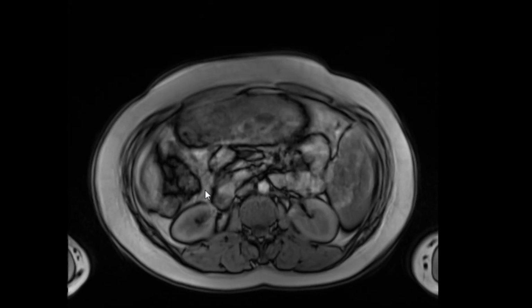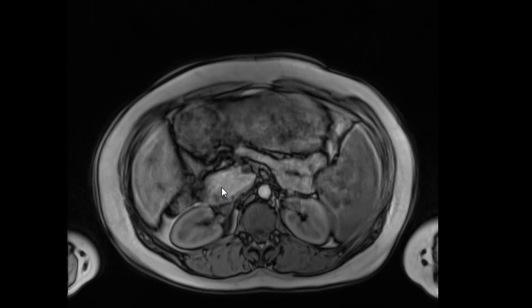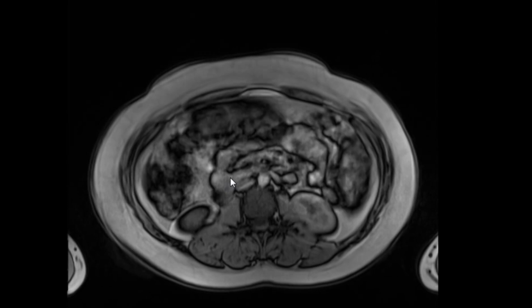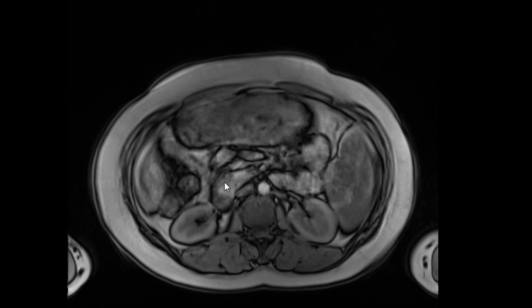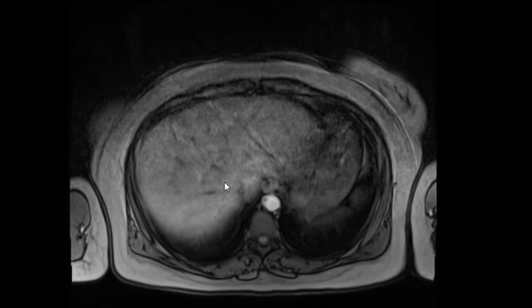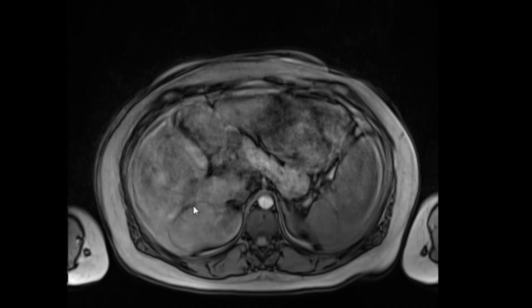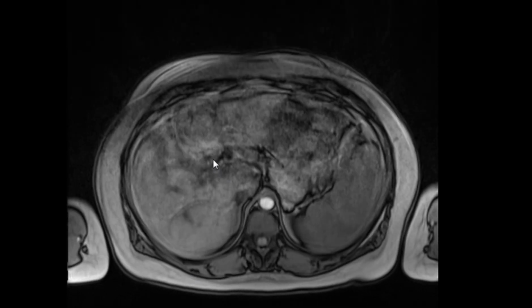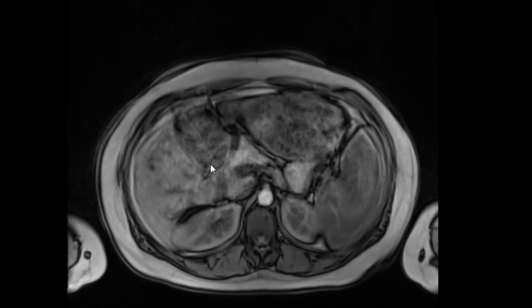So let's take it from another perspective. What are the radiologic features of gastric outlet obstruction? Distended stomach. Okay. What else? Only the stomach will be distended? Duodenum, maybe. The duodenum is the outlet. Antrum. Okay. Is there any duodenal distension? No signs of duodenal distension.